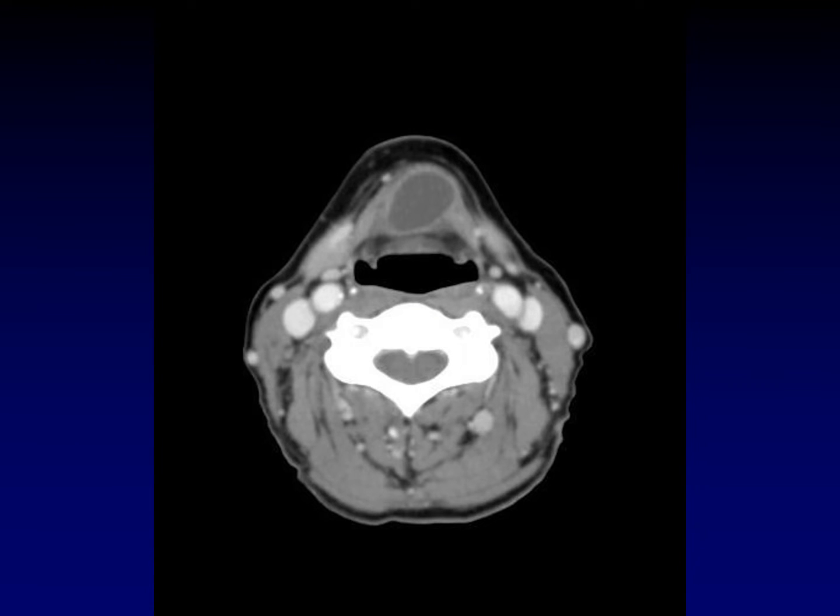This is the classic radiologic appearance of an infrahyoid thyroglossal duct cyst. Note that the center of the cyst is just off midline because it's infrahyoid, and look at its relationship to the strap muscle. The strap muscle is coming up and clawing, forming a claw sign around the edge of the cyst. This intimate relationship between the cyst and the strap muscles is critical for this diagnosis. This is a very simple cyst with nice smooth walls. More complex cysts will arise with repeat infections. Infections are in fact how these usually come to clinical attention.